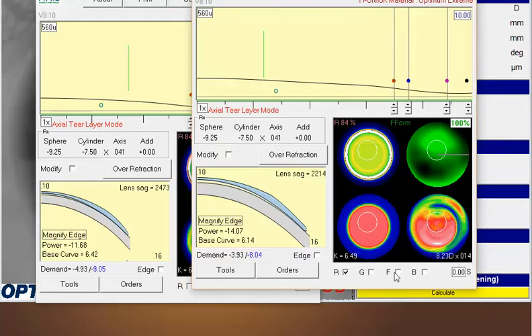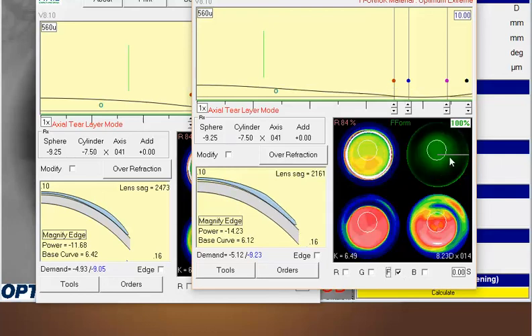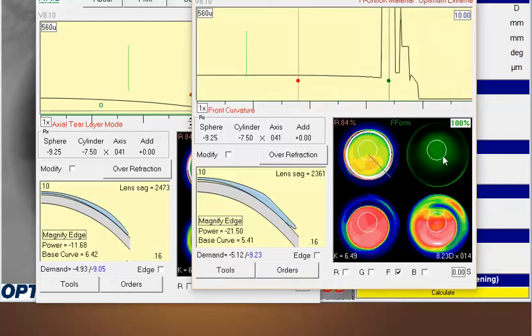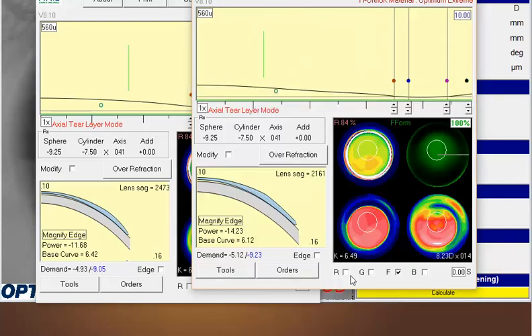And then if you want, you can either leave it in that spherical or click to freeform if you want to try to capture a little bit more of this peripheral data out here to kind of get that lined up. And then I did not redesign it after that, because if you hit redesign using current settings, it'll go back and set this lens back the way it was before you made your manual adjustments.